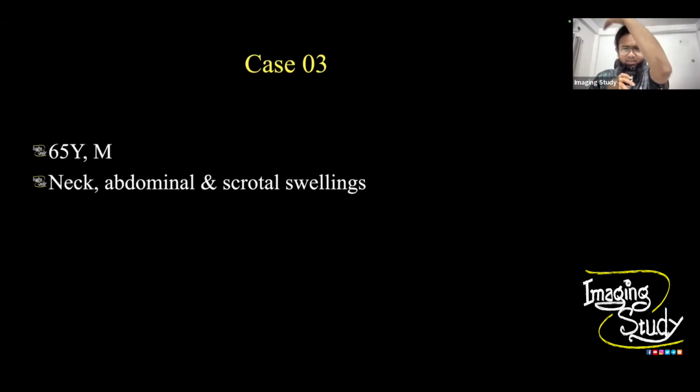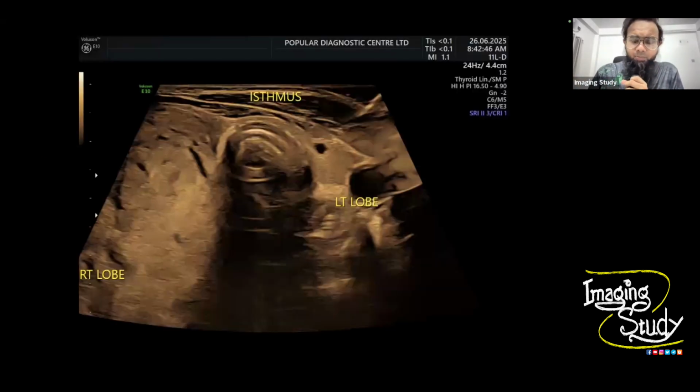So anyway, I started asking the patient, what's your problem? The patient said that he only has a problem with a hernia, so he needs the hernia solved. Okay, that's it. Let's jump into the case. I will start with the neck now, because I started with the neck in the actual patient, so I can describe it sequentially.